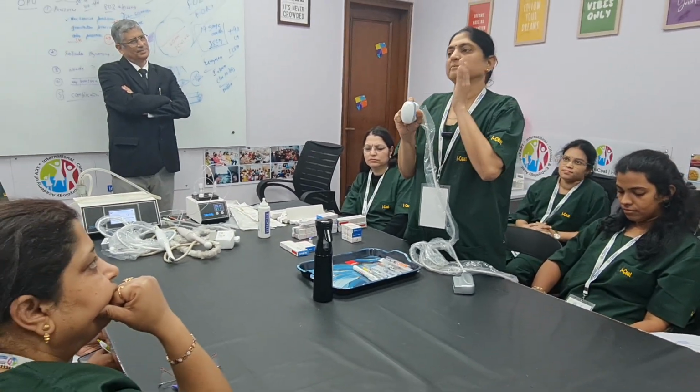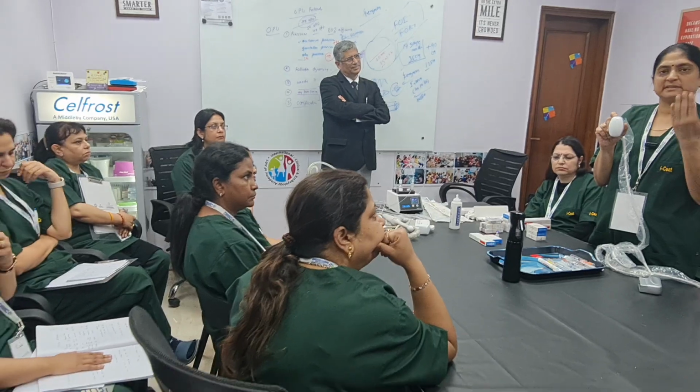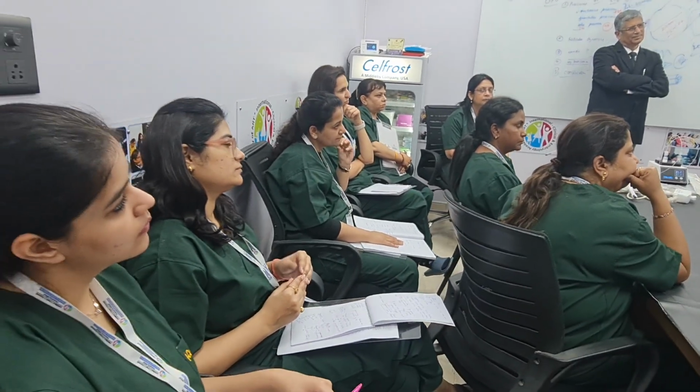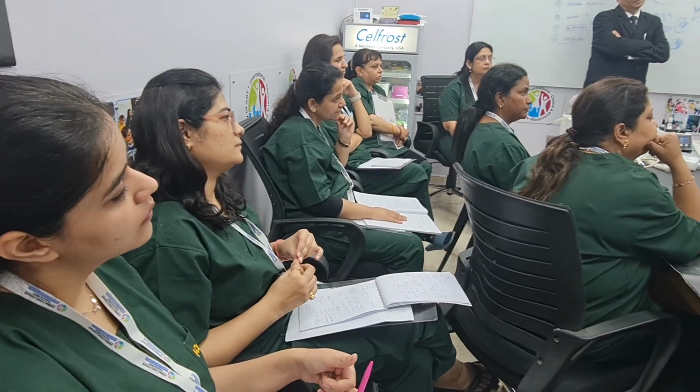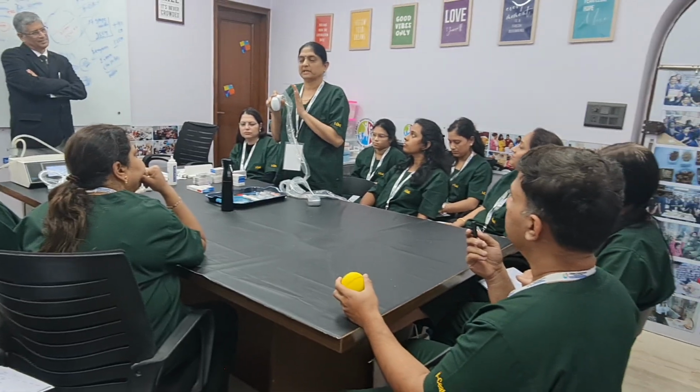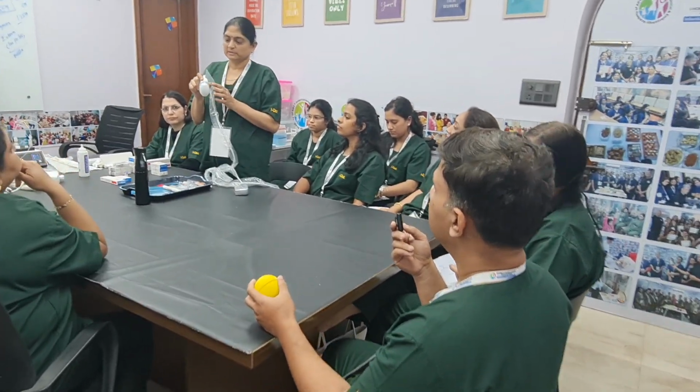Every probe has some frequency. We have frequencies of 2.5, 3.5, 5 megahertz, depending on what structure we are seeing. Whenever it is for abdominal probes, it is either 2.5 or 3.5 megahertz. It's always in hertz.